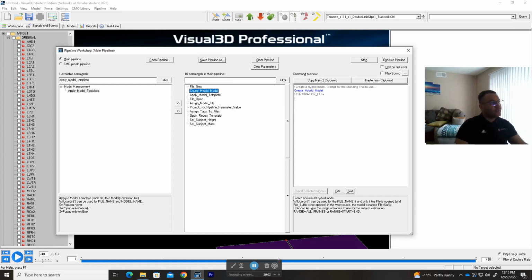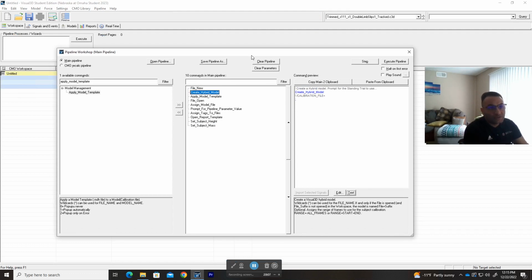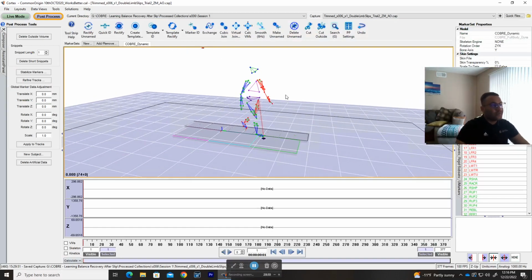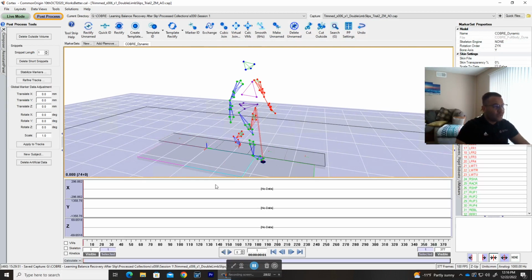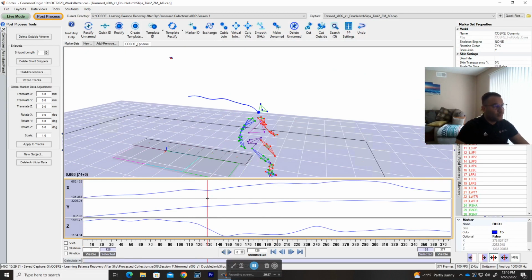So once you finish this and you have everything on your workspace, the next thing you want to do is condition your data. So data processing, you filter your data. Whatever you have completed on your motion capture software, you want to finish the rest in here. So for example, for this project we collected using Mac, and this is data from Mac.